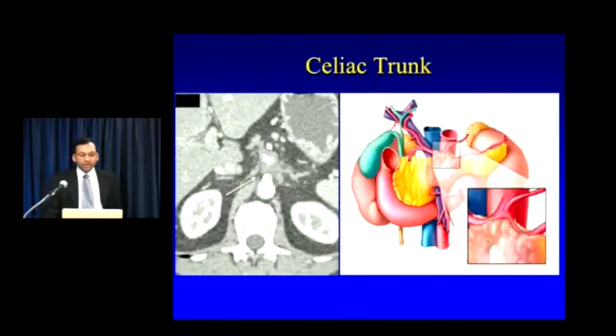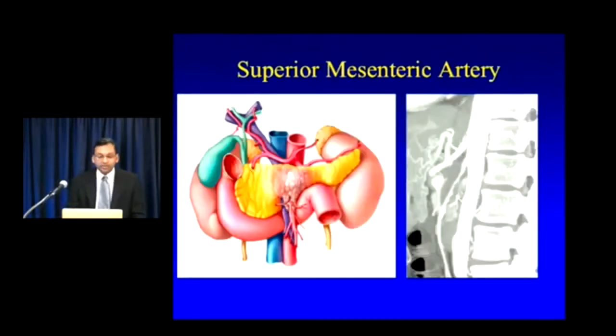Now, arterial involvement, again, you want to be more exact. Here's a patient who has encasement of the celiac artery, so my dictation would say that there is 360-degree encasement of the celiac, and there is clearly some involvement of the hepatic artery as well. Here's another example.